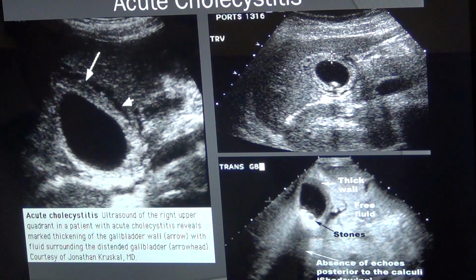And in hydrops gallbladder, you measure the diameter inner to inner, only the anechoic area. For example, if you want to measure here, measure from here to there. If it is 5 centimeter or greater than 5 centimeter, we call it hydrops gallbladder. So make sure you notice it. Otherwise, the gallbladder can burst. And you know if the gallbladder bursts, what is going to happen?